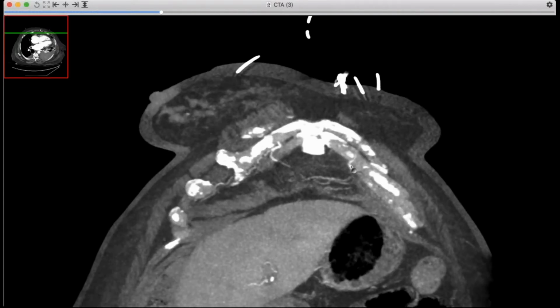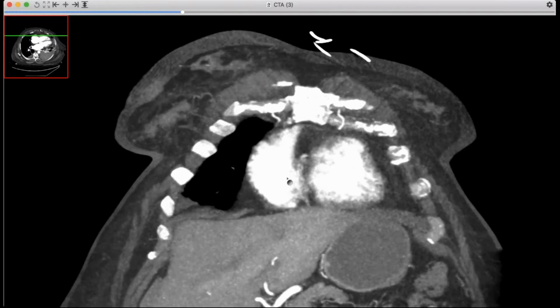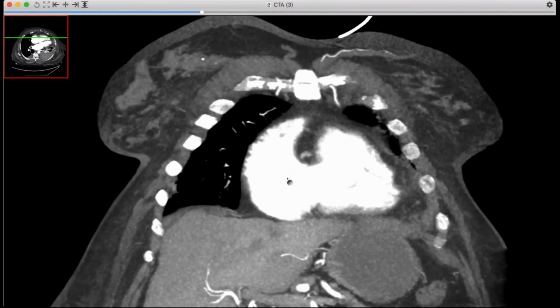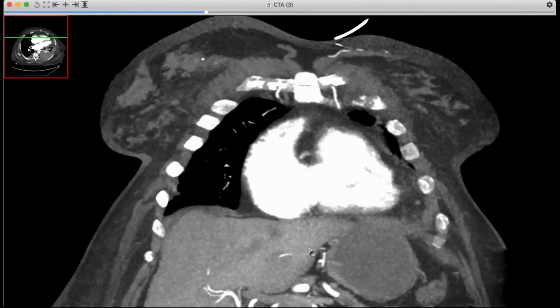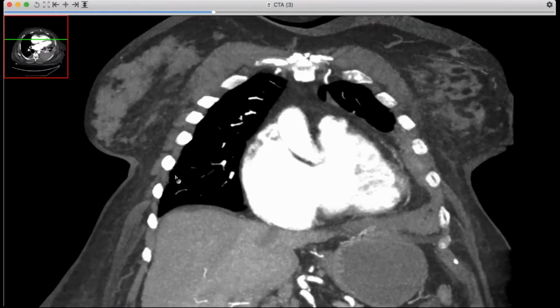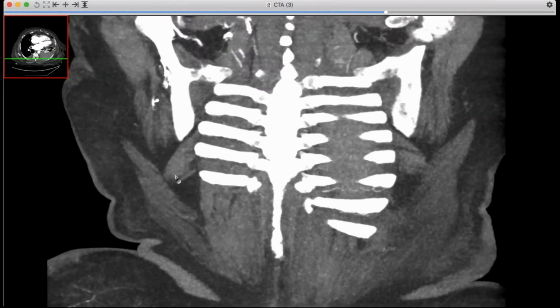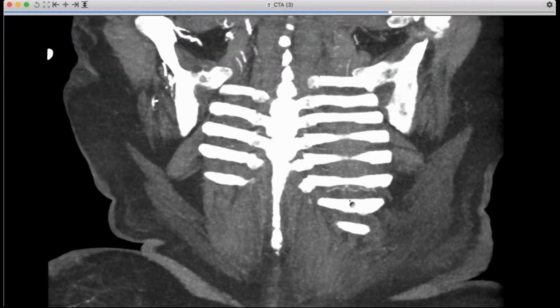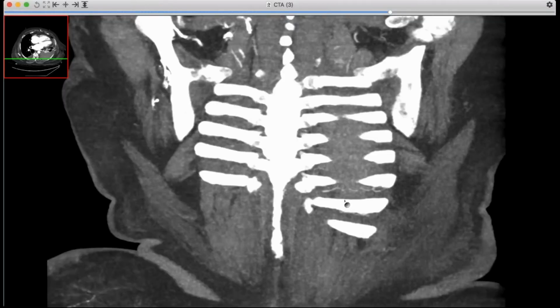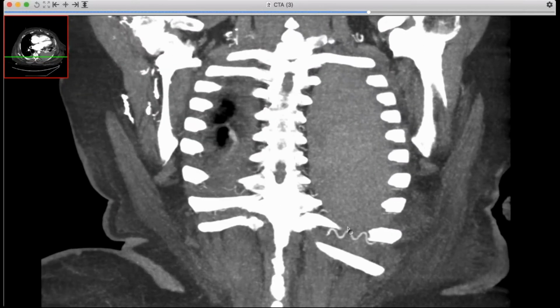It's much more internal mammary blood flow with very small branches that sometimes are below the resolution of CT unless you've got really intense contrast. But you can usually resolve a 1 or 2 millimeter vessel, but you just don't see any visible intercostal arteries anteriorly. So it's important when doing these interventions to be aware of that, and we really have to hug the periosteum on the upper surface, but it's always a possibility. But in older patients in particular, these tortuous vessels can be quite impressive.